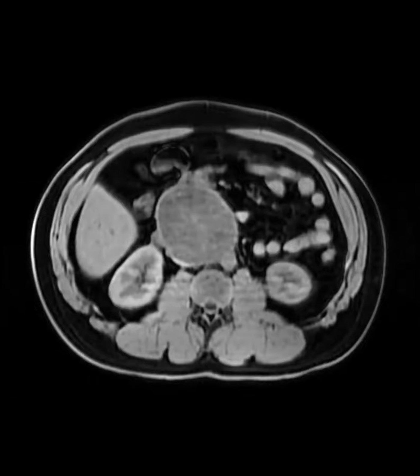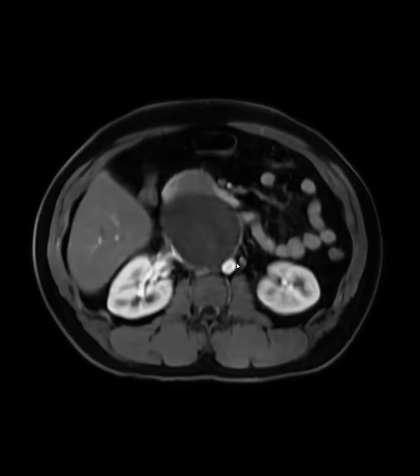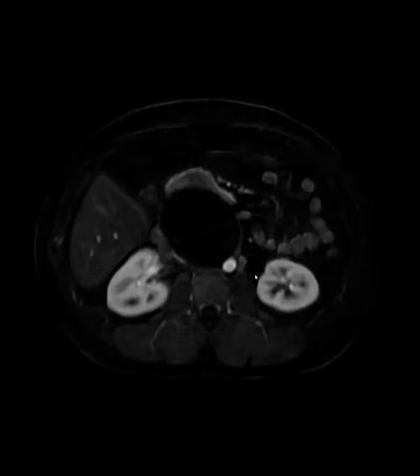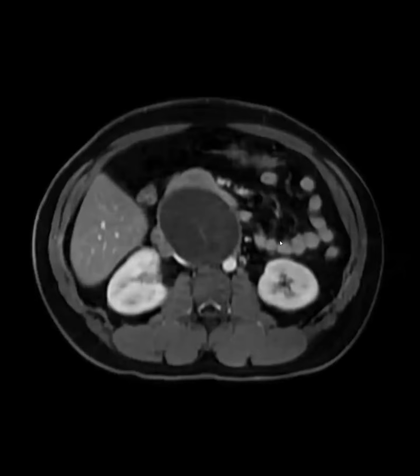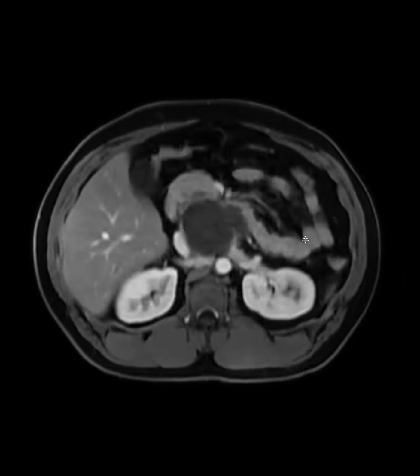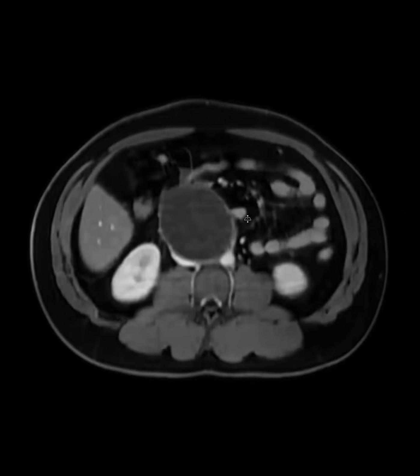Not very T1 hyperintense, arterial. I'll point out, and I'm going to show you the subtractions. So the huge mass that was T2 bright with a central scar basically does not enhance. And the two other blobs on the side do enhance. So something that kind of outgrew its blood supply, necrotic here, but these guys are still active.